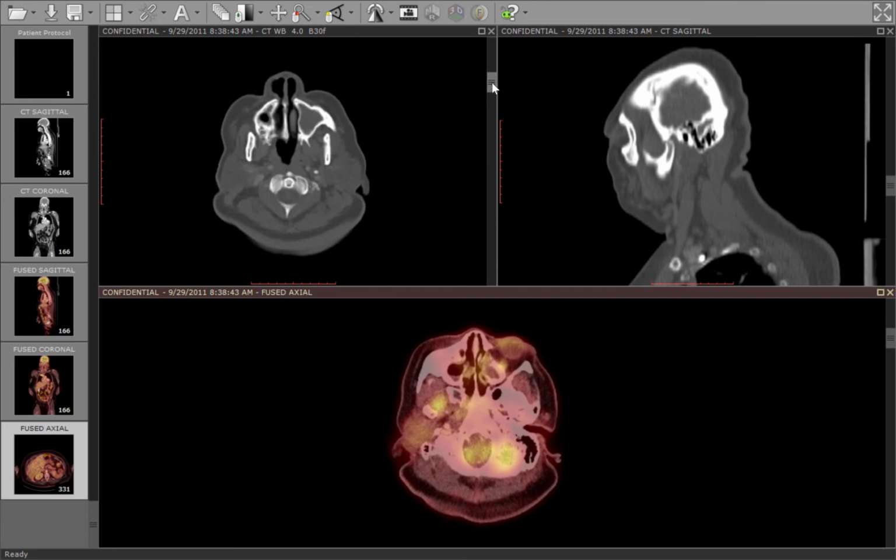I'm not sure that's what's going on here because the expansion is somewhat subtle, and it's possible this patient just had a larger sinus on the left that is full of stuff. But again, when you see a completely opacified sinus, you really want to look for any expansion of the walls and suggest the possibility of a mucocele. And that's it.